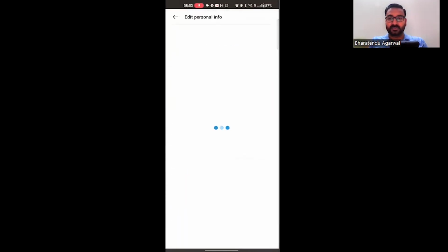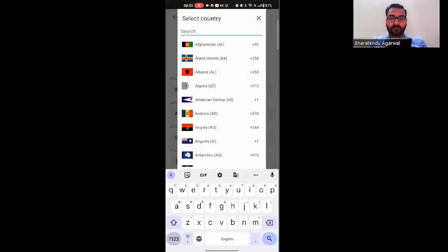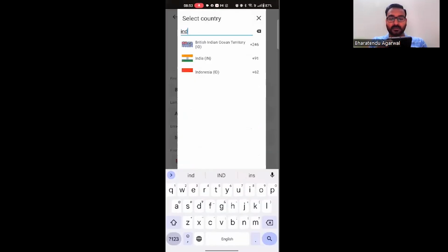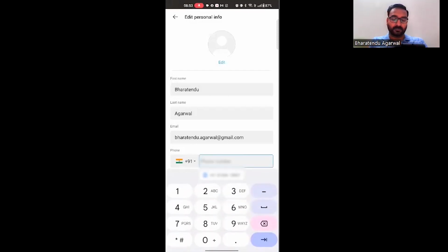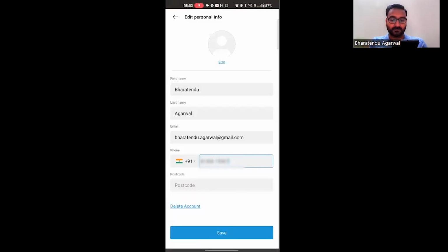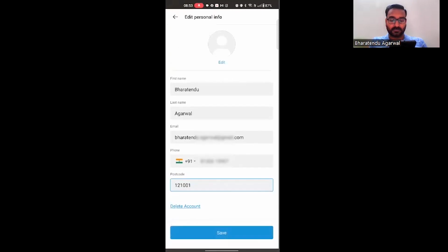So settings, personal information. So I'll update my phone number here. Or maybe I'll do that later. Or yeah, let me just do it anyways. I'll blur it out for you. 8101107. Postcode right now is 121001. All right. Save.